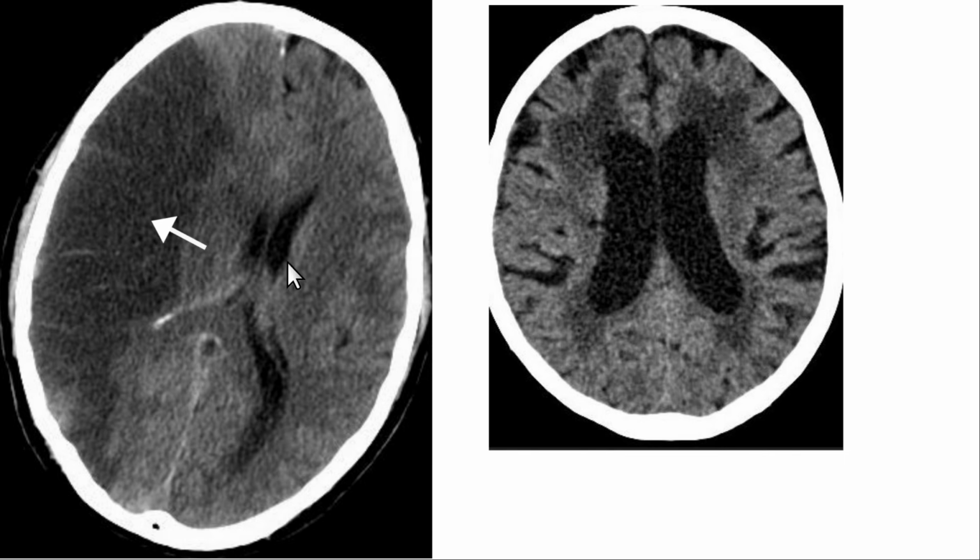Okay, now here's something. These are relatively uncommon. Yeah, I see them, but I don't see them that often. This is what we see every day. There is a lot of periventricular lucency. You can call it hypodensity. It should be more like about like this.